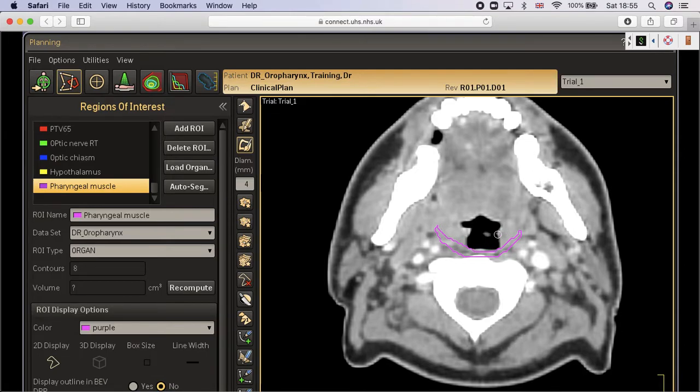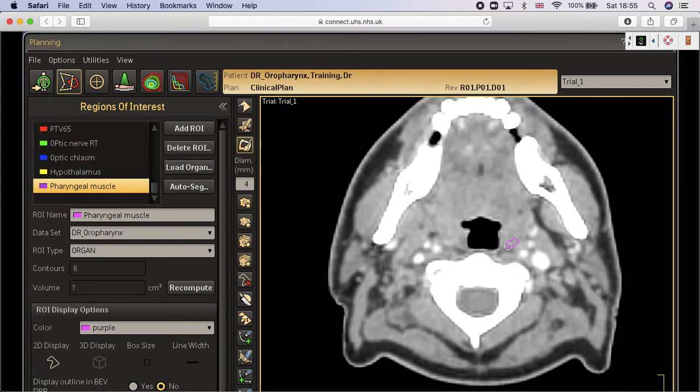Okay, so whenever you go down to the oral cavity, the pharyngeal muscle will start to be plate shape, something like that, and will be even a shorter plate, because it will be just on either side of the tongue and the hyoid bone when you go more and more down.